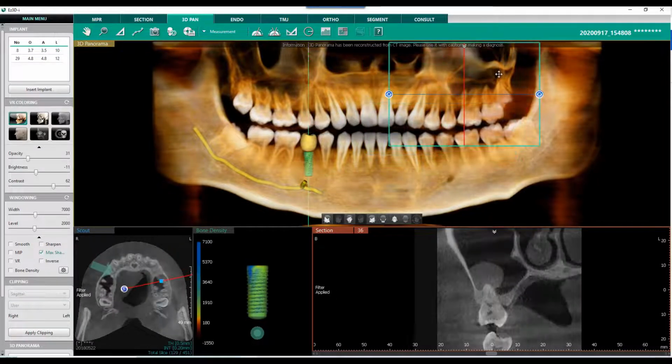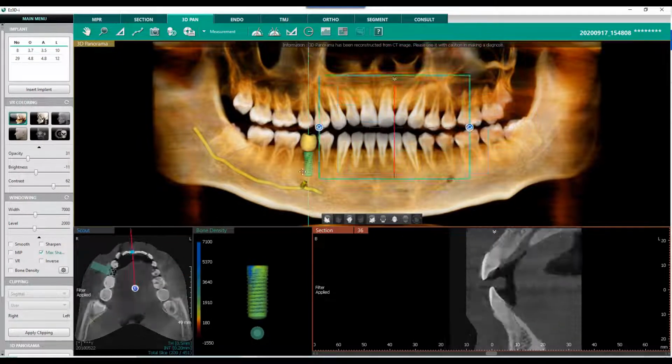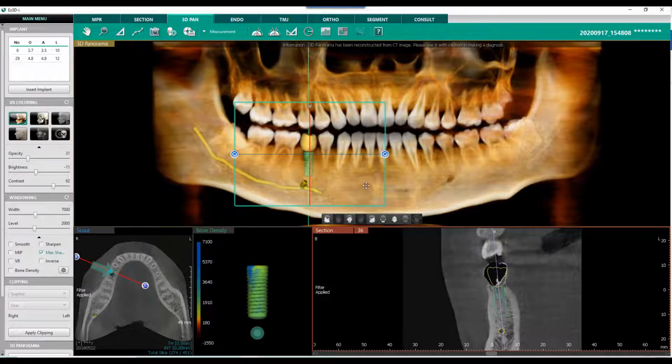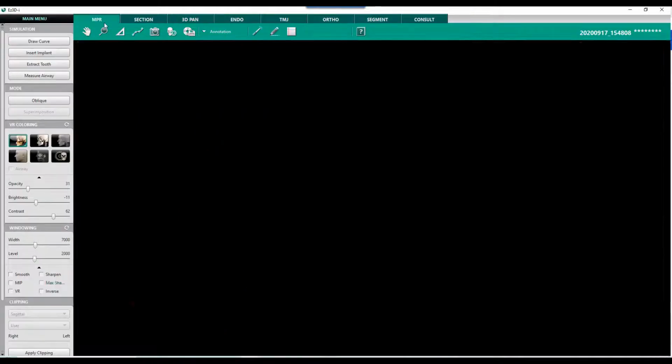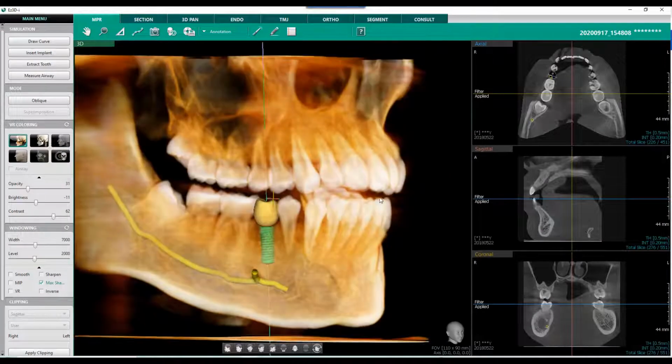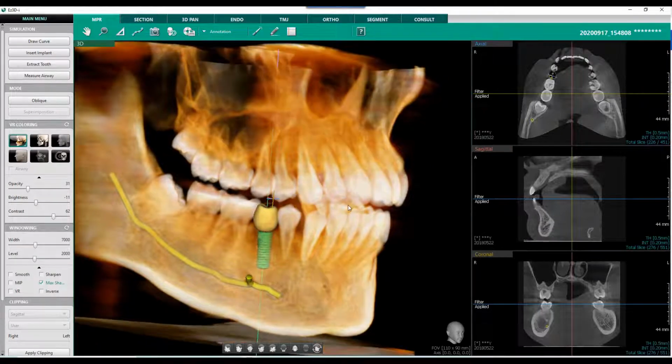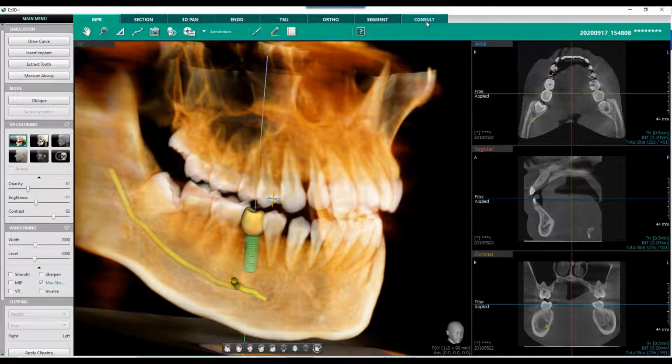And really, we've kind of identified different pathologies in the scan. We've traced our nerve, we've planned our implant, and this has all been within right about 5 minutes. So I think the majority of the time we spent was really analyzing the scan itself for any secondary or incidental findings. From there, we did go through and take some screenshots.